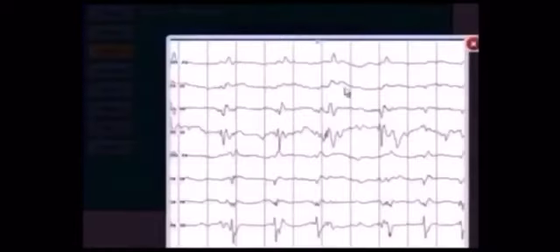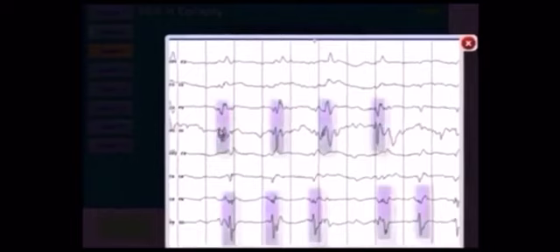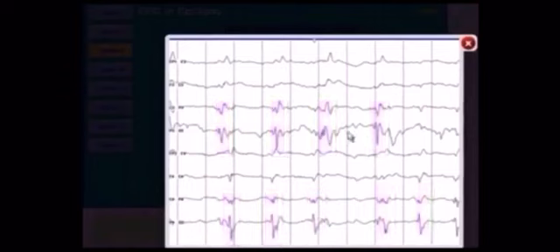What do you see here? So this is an EEG which is slow. So you're looking at the left hemisphere and the right hemisphere. There are sharp waves with maximal amplitude in the occipital region. So both O1 and O2, you see these sharp waves here. So these are occipital sharp waves. And this EEG suggests that this person has a high risk of seizure onset from the occipital head regions bilaterally. So the correct answer, select occipital sharp waves. This is the correct answer, and we've gotten it right.